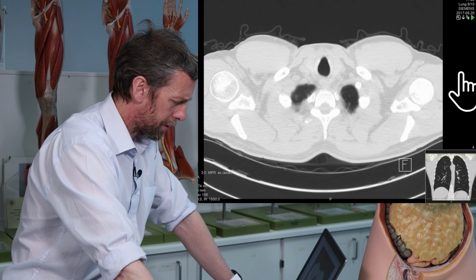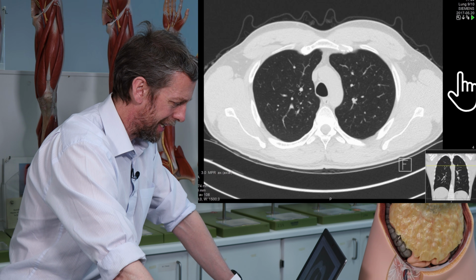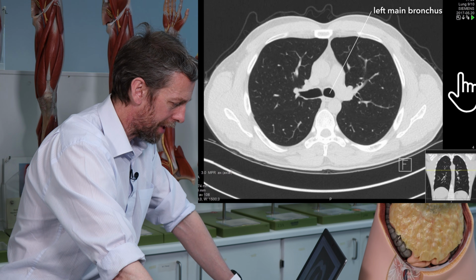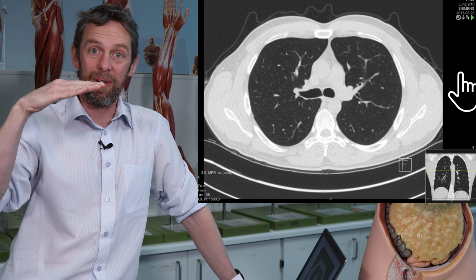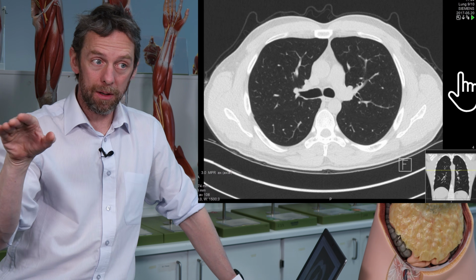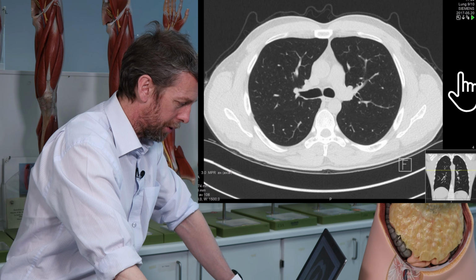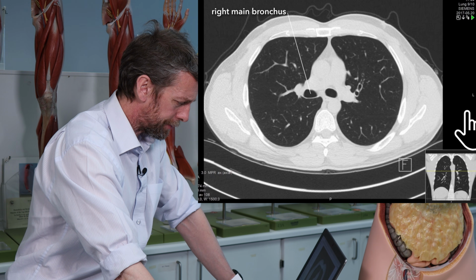So trachea, and then the trachea is going to bifurcate into left and right main bronchi, and look how one main bronchus runs a little bit flatter than the other one. Got to think about your cross section here. The tube is doing that, so it's looking long, and the other one is steeper.